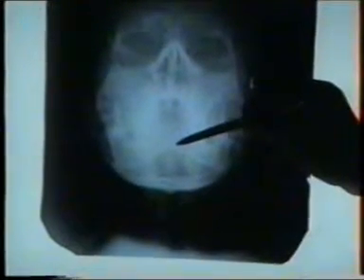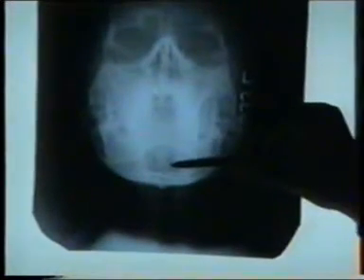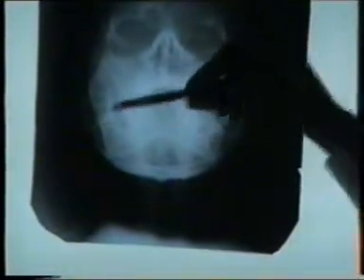On the same X-ray lower down we see the odontoid process and the mentum. Now to note whether the extension given to the patient's head is adequate or not, this acts as a guideline: the odontoid process should lie below the mentum. If it does not lie below the mentum, the petrous apex of the temporal bone would obscure the view of the maxillary sinus and would give us a false clue that the patient suffers from maxillary sinusitis.